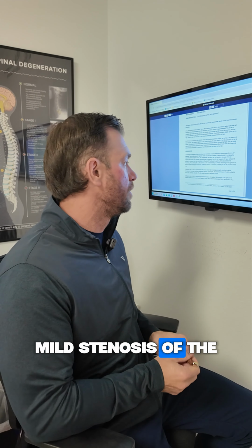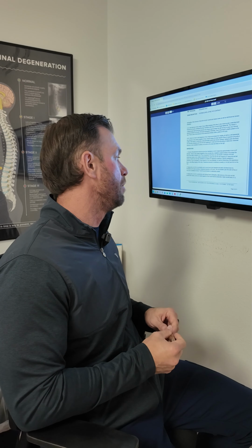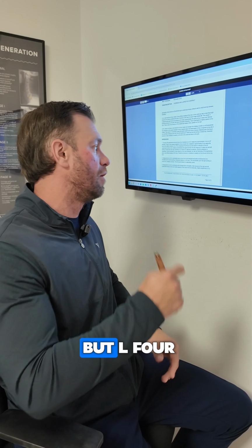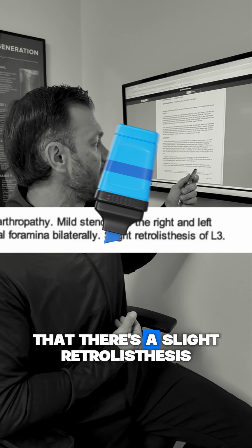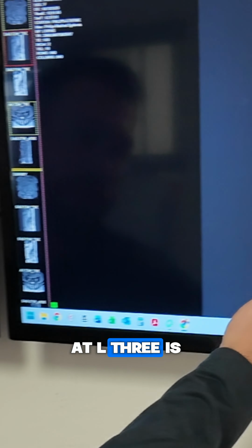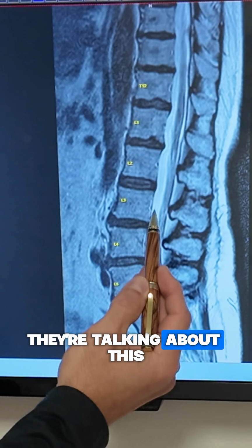Mild stenosis of the right and left foramen. Stenosis at both levels, bilateral. Again, not just at L5, but L4. And then they say that there's a slight retrolisthesis. Now we're getting into some crazy terms here. At L3 is the retrolisthesis, okay? They're talking about this bone right here.